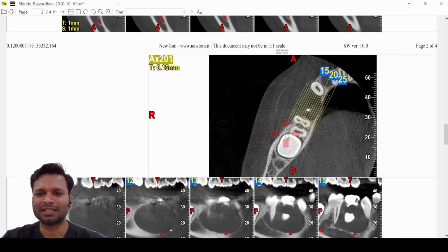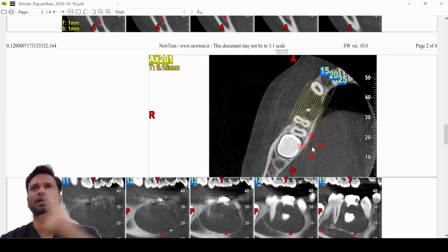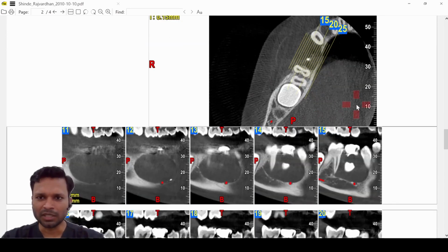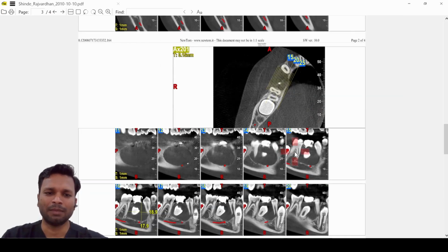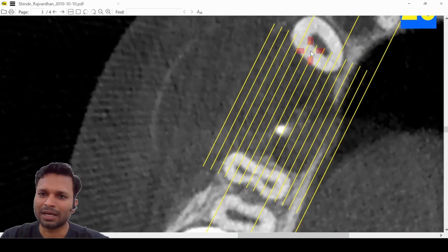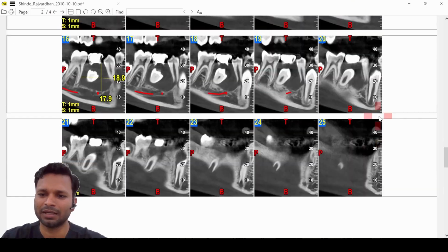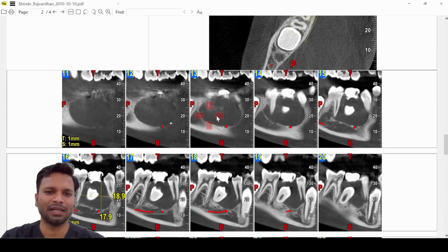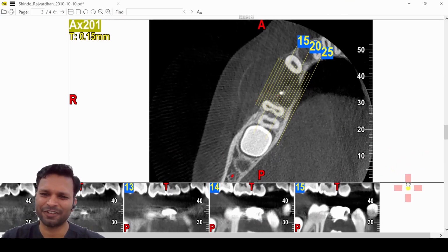Now this is again the axial slice. इसमें क्या slices दिए हुए हैं? Which is going lateral to medial, left to right. Sagittal slices. Okay. Now sagittal slice is going to give you the dimension of this lesion anterior posteriorly. Okay. So हमने almost सारे inferences तो निकाल लिए. Further again slices number, again this is 15 number ना, तो 11 to 25 slices रहेंगे. So 25 and 11.